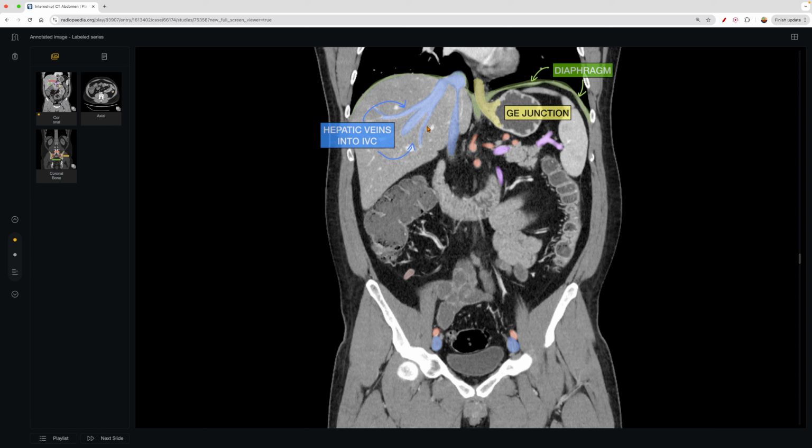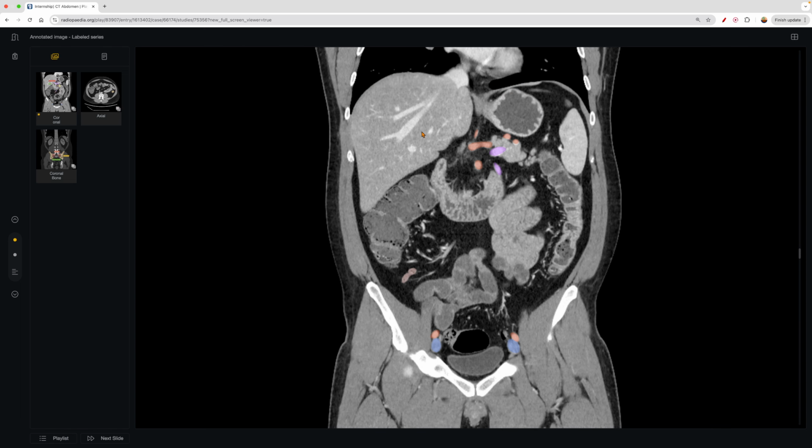And then while we're here, you can see the liver has its hepatic veins, and you'll see in this contrast study with IV contrast, you can see the organs very well. We'll see a few examples perhaps where they don't have IV contrast, and it's a bit hard to make out the difference in the organs. Although, yes, it's possible, it just makes it a bit more challenging.